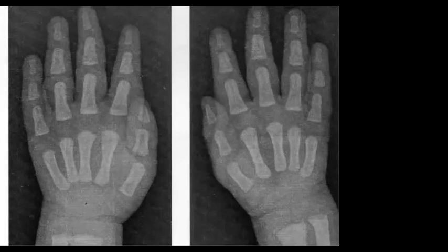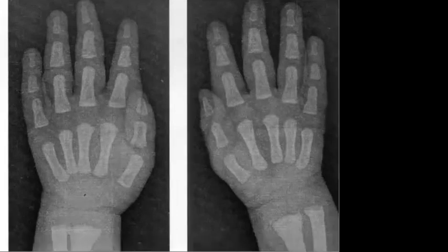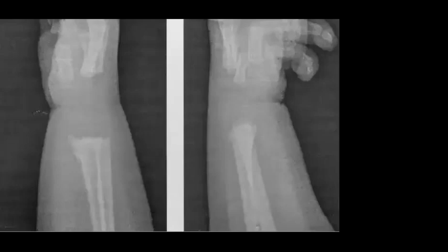In rickets, you know, always have what's called metaphyseal cupping, fraying, and so on. I think if you go to check the skeletal survey, you'll find easily the metaphyseal corner fractures, which is highly specific or highly suggestive of non-accidental injury.